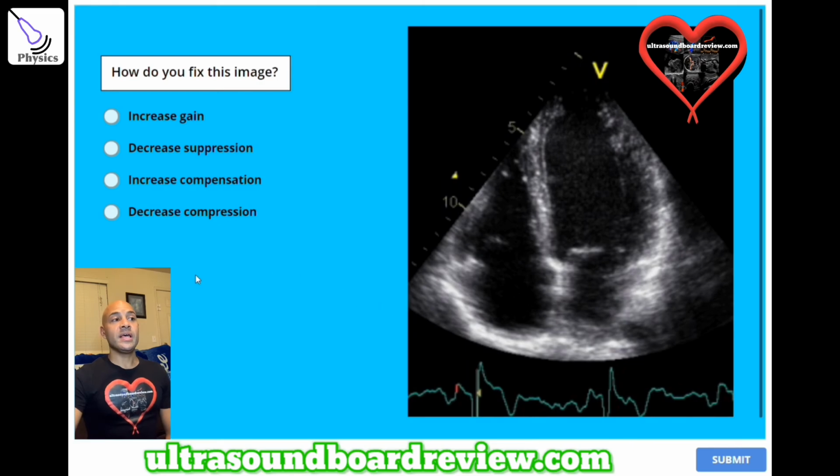The answer is B, decrease suppression. Suppression is a synonym for reject and threshold. So what's going on in this image is the reject is turned up, thus suppressing the low-level frequencies in the chambers here, but it's decreasing our detail in the myocardium throughout the heart.